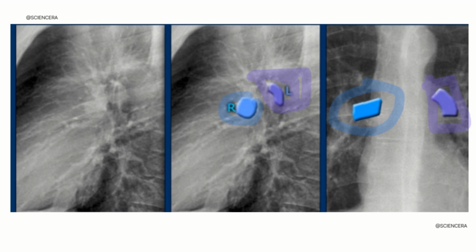Based on these findings, they diagnose the patient with sarcoidosis, a condition where the immune system causes inflammation in different parts of the body, including your lungs. They also notice that the line near the trachea, your paratracheal line, is wider than normal, which is another sign of enlarged lymph nodes. By looking at both the front and the side view X-ray, doctors can accurately diagnose conditions like sarcoidosis by identifying abnormalities in lungs and surrounding structures.